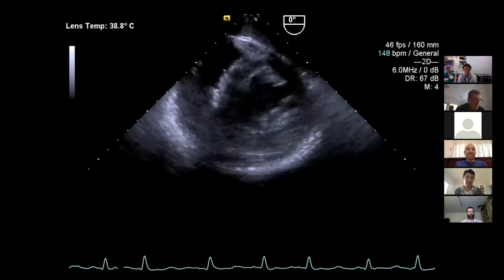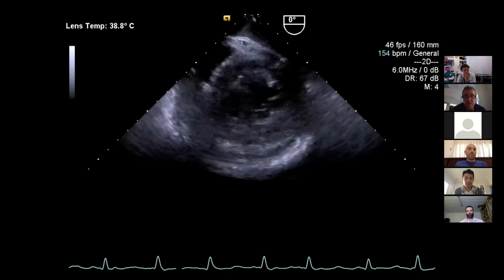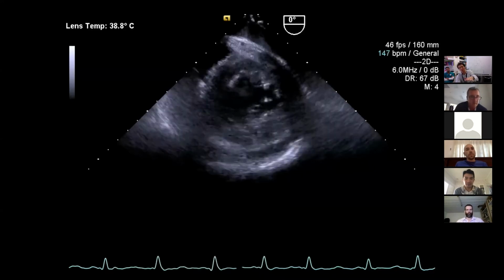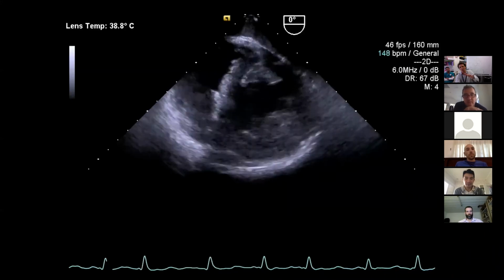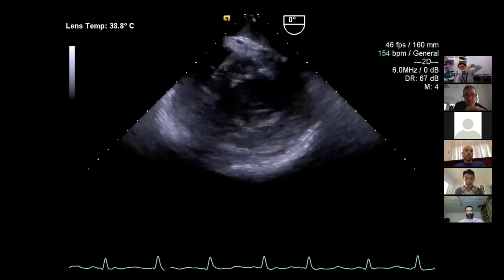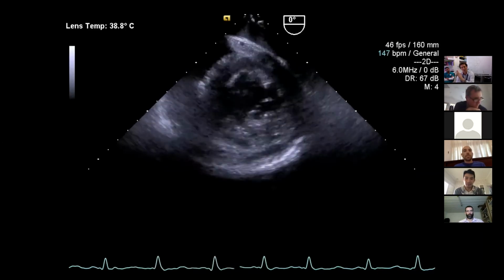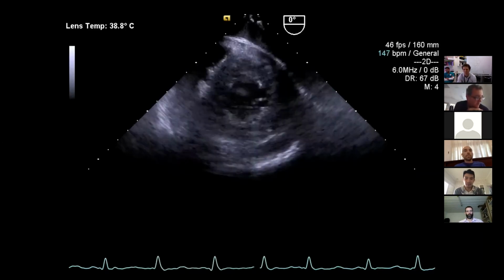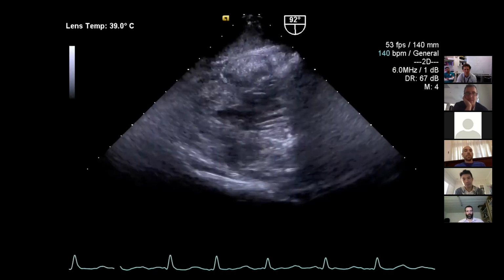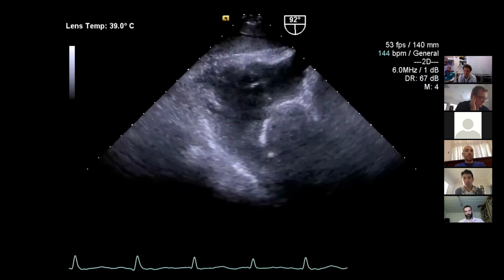So that's a mid-esophageal short axis. Sorry, I think it's a bit more in the gastric region for the short axis rather than the mid-esophageal. Because I think the mid-esophageal is more the four chamber, and then as you come down into the gastric, the plane sort of turns around and gives you that short axis. So I think it's the short axis. Yeah. Okay. Cool. I think it's at the level of the mitral valve leaflet. Yeah, maybe a little bit down. Sorry, I wasn't perfect, just in the interest of time. Oh, this is cool. So what's this view?